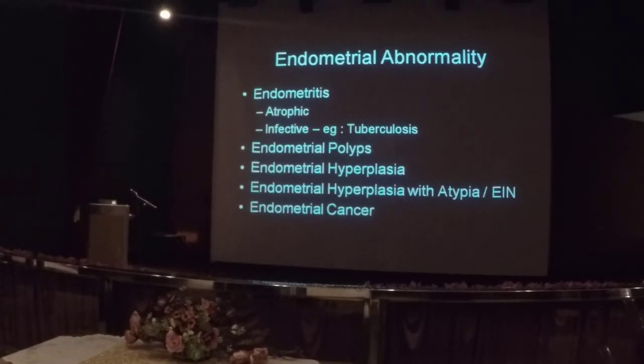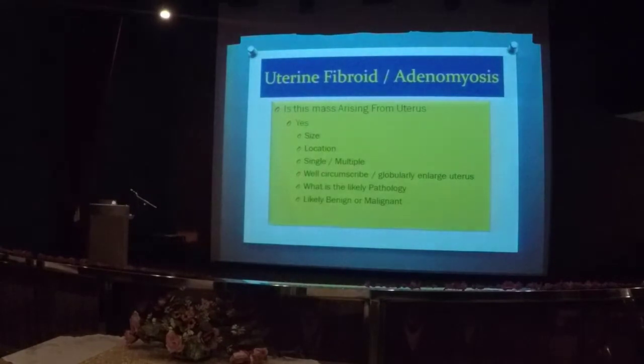I think the youngest that we have currently is about 14 years old, who just came in with abnormal menses, and the only finding is that the endometrial thickness is very thick, more than 20 millimeter. So pay attention to the endometrium when we do an ultrasound scan.